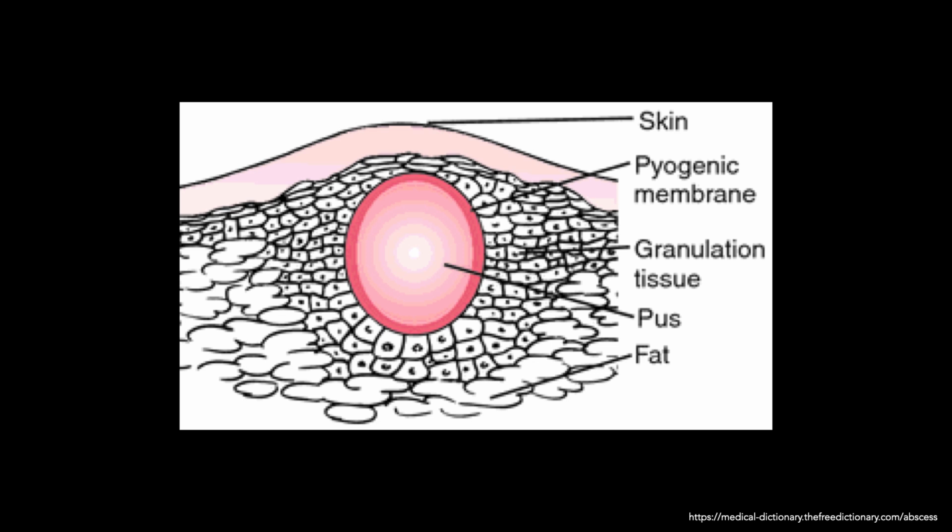And again, we're going to talk about this in the context of subcutaneous abscesses, but you can really apply some of these principles to intramuscular abscesses and things like that in other different places. But essentially, we have in the subcutaneous layer the necrotic core, right? They called it here in the label the pus, right? Essentially, all that inflammatory debris, all the necrotic cells, the evidence of the battle that is taking place in the subcutaneous layer is going to be in that core of the abscess.